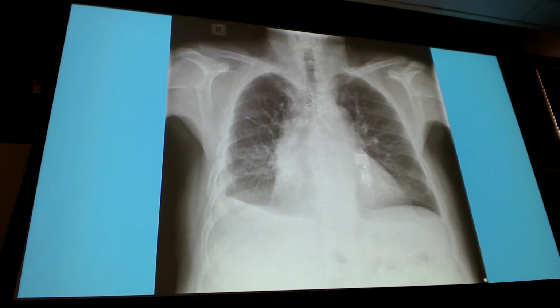Right? I obviously can't ask you in one question all the things that are wrong with this chest x-ray. I can't. And this is just showing you another example of how it's so hard to just find one thing wrong, because these patients are usually pretty sick when you're starting to get to some of these things. So read the question. Anybody know what that is?